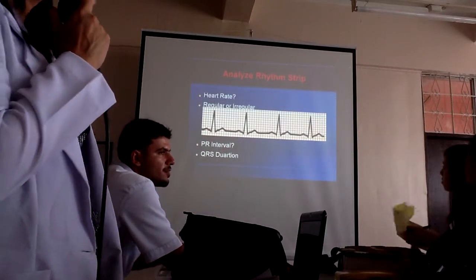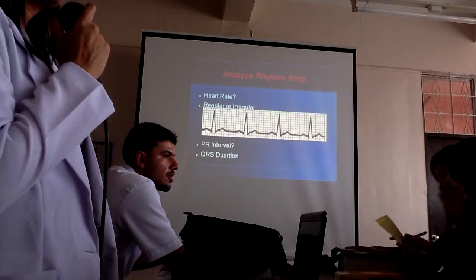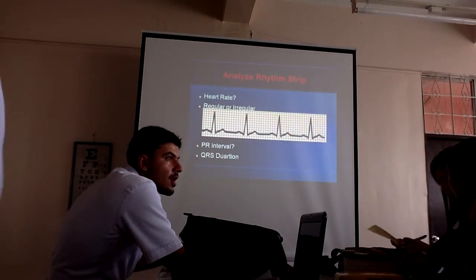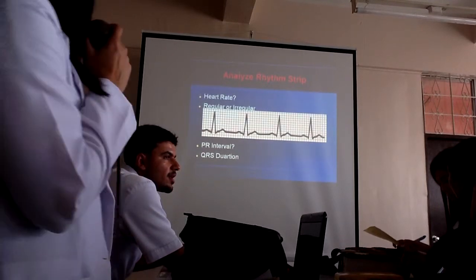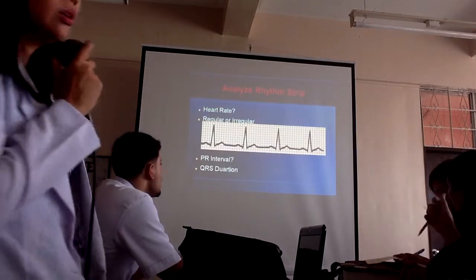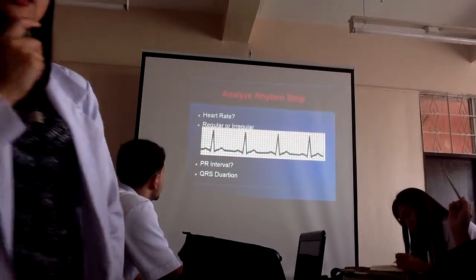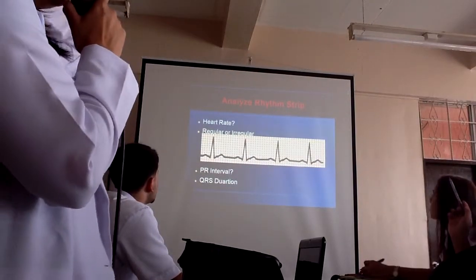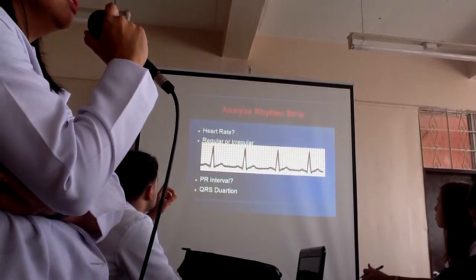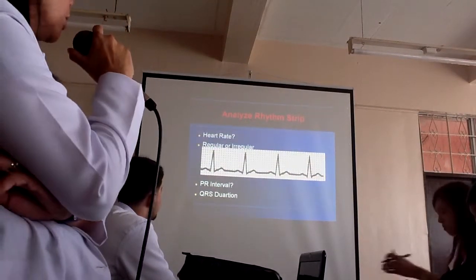Beginning of your P, the beginning of your Q. So what is it? Who knows? What's the PR interval? Point. Now, 12 to 20. 12. Pag 0.6, abnormal na yun. 0.04 yan per square. Okay? 0.04. What? Ano man? Sagot. 0.6? 0.16. So what about your QRS?